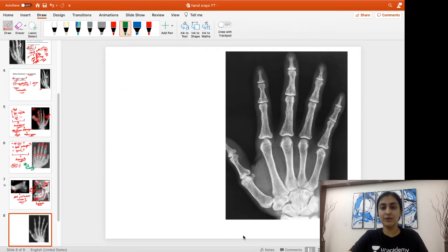Alright, so with this background, let's look at the fourth pathology that we have here. Very, very important.